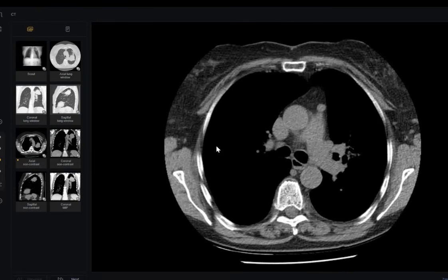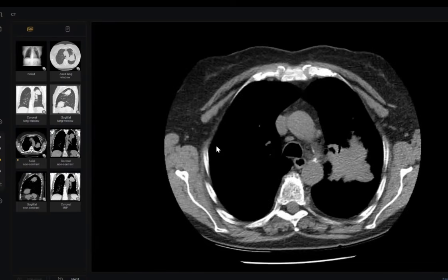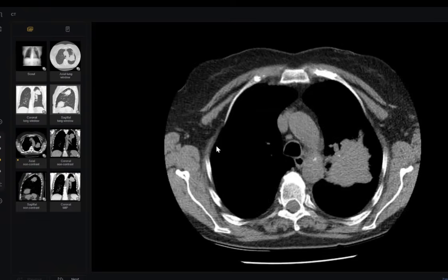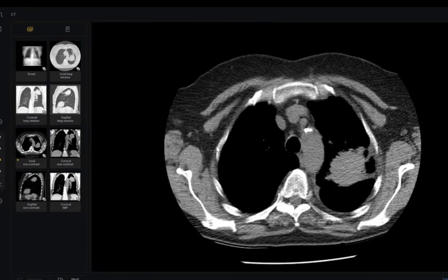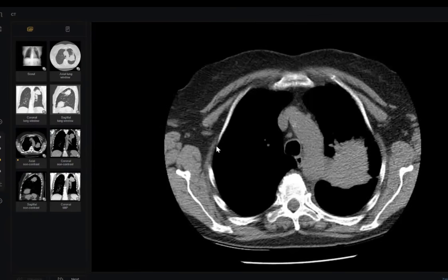What is your final diagnosis? So my principal diagnosis is lung cancer in this case, and because this lesion is closely related to the bronchus, an EBUS endobronchial ultrasound biopsy can be performed. The patient will then require a staging CT, which will include the abdomen in the contrast-enhanced portal venous phase, and next PET imaging for distant metastases, and referral to the pulmonary MDT for management.